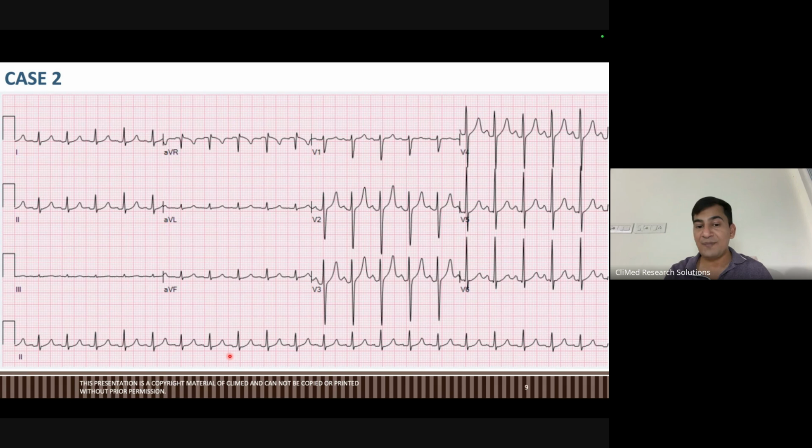If you see there is no P, then you can see there is a little upward deflection. At this junction, at this red point, you can see the P wave clearly. Here it is most visible. Here also there is a very low QRS complex, but after that you can see one T wave here and one P wave here, T wave here.